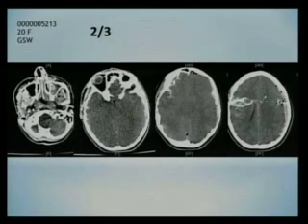Okay. This is blood from her initial wound. So this is what Dr. Yang calls no evidence of effective cerebral circulation. Is that correct? Anyway, the patient was brain dead.